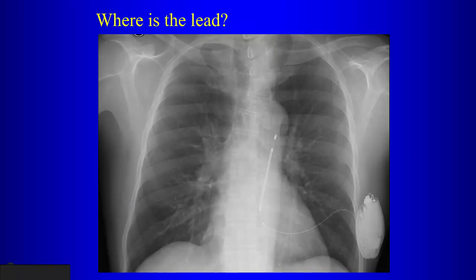So this thing looks a little bit unusual. So where is this lead?